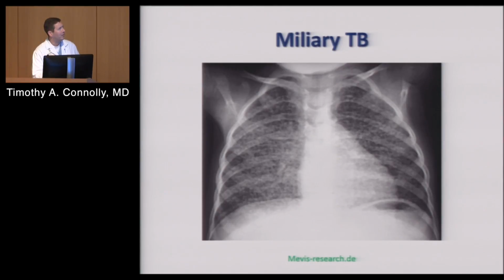This, on the other hand, looks like tiny, tiny little millet seeds. This is a pattern of tuberculosis that's very unique. I personally have never seen it. I've read about it. It's on exams, but I've never seen one clinically.